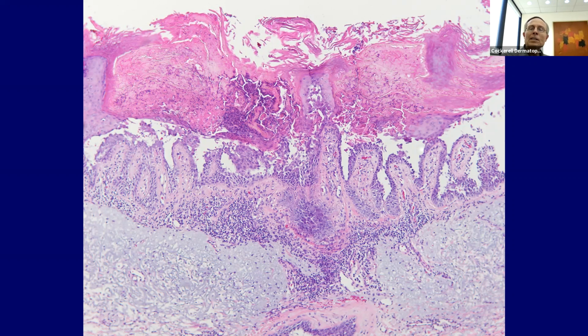If the acantholysis is present, is it just above the basal cell layer? Is it just beneath the cornified layer, maybe in the granular cell layer? Or is it diffuse, going throughout the entire epidermis? What's the extent of the acantholysis? And what's the extent of it horizontally? Is it tiny foci, like Grover's, or more diffuse, like here? Those are all things that help us.